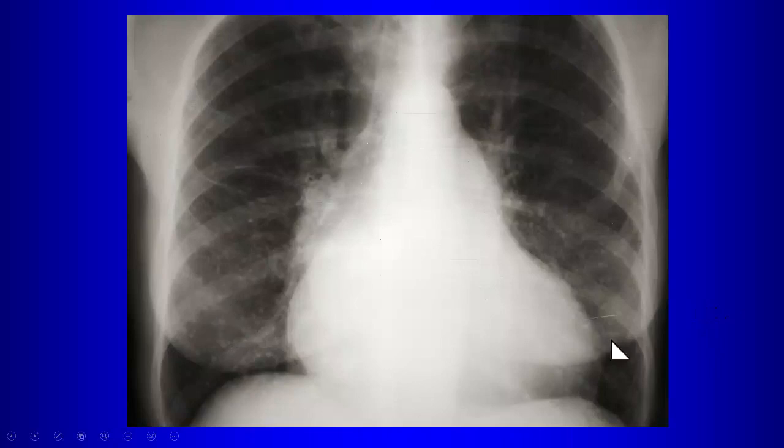So this patient also has dense nodules here at the lung bases, but there's another abnormality. What's big in the heart? Right atrium. Anything else? Any other chamber? Left atrium. How do you know left atrium is big? There's a double density here, right? It's pretty subtle. Carinal splaying, that's a tough one. Although, yeah, that is a sign of left atrial enlargement.